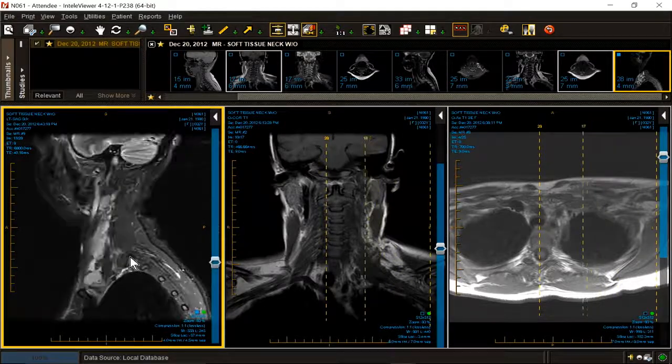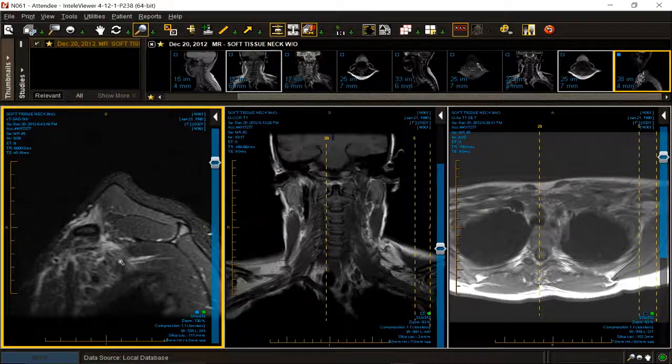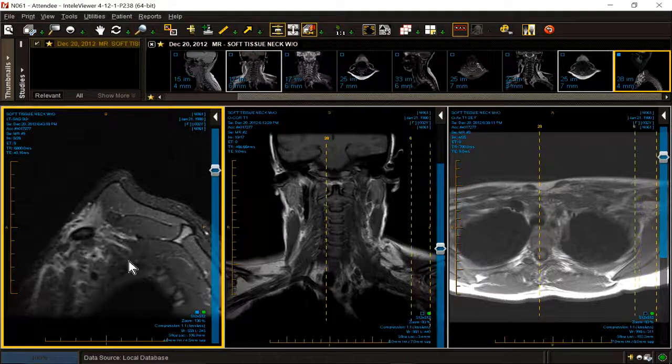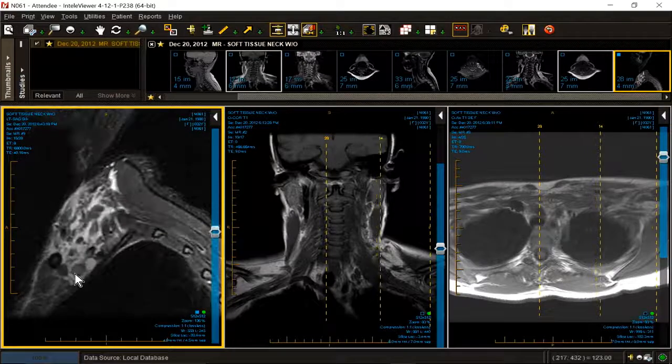We're going a little longer on this case because it's so important and so complex. So right here is your clavicle. What's underneath the clavicle? The subclavius muscle. One of the uncommon causes of thoracic outlet syndrome is subclavius muscle hypertrophy. Unfortunately, she has it. I'll blow it up a little bit. She was checked for factor V Leiden. She is heterozygous, so she's got 2 risk factors for thrombosis. Now, unfortunately, the anatomy is rather distorted, and you're going to see the occluded subclavian vein.